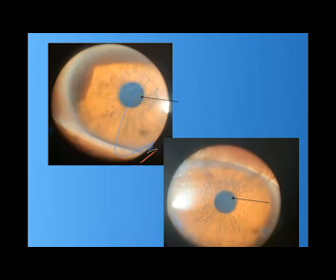This patient's age is 45, with stable refraction and good best corrected visual acuity, and with these faint opacities in the cornea, which help you accept the irregularity of the corneal surface and the steep points, which are beyond the normal.